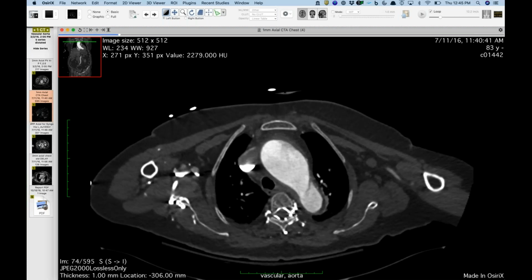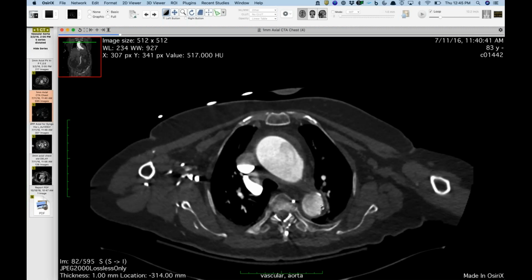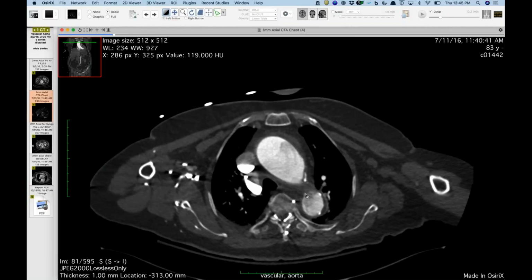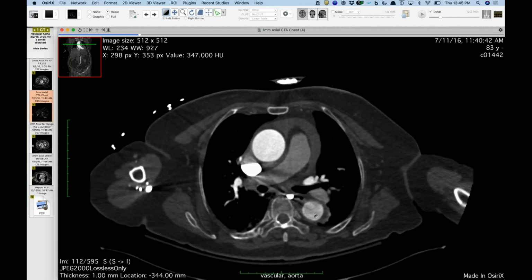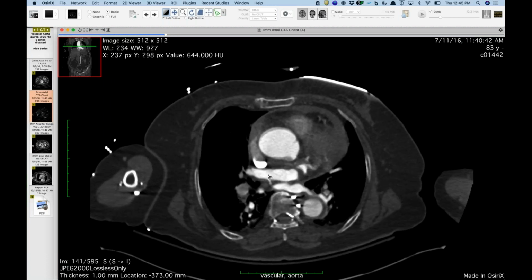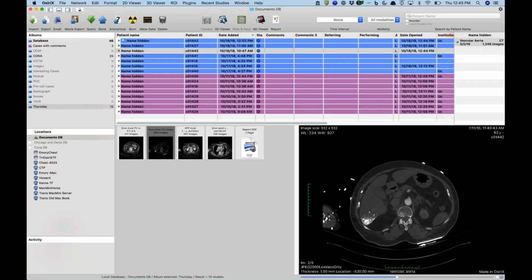Unfortunately, there's no non-contrast study here. My resident correctly thought that this was all just flow artifact and smoke in the aorta, which certainly, you can see the arch, very wispy, ill-defined, extends into the descending thoracic aorta. And then the ascending aorta looks a little bit big. I think in general, it's a small patient because this is still only 3.9 centimeters.